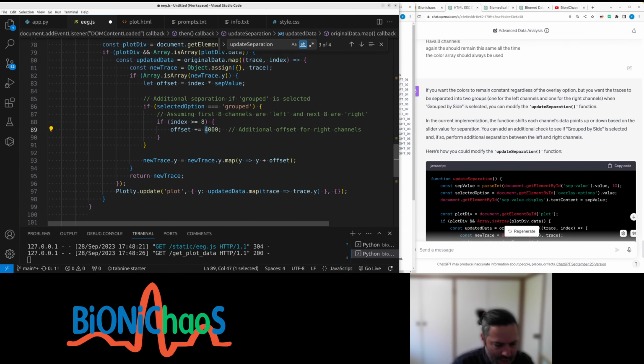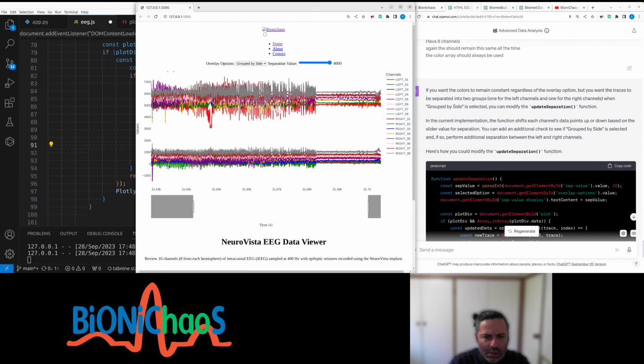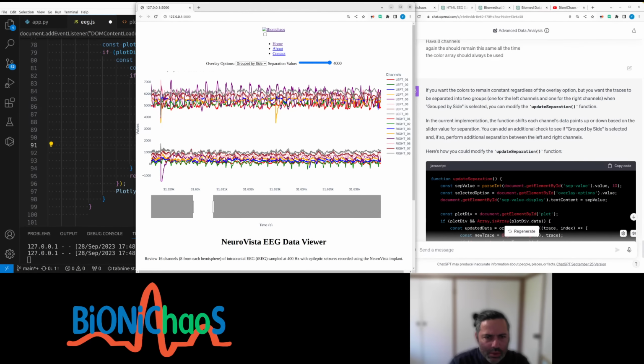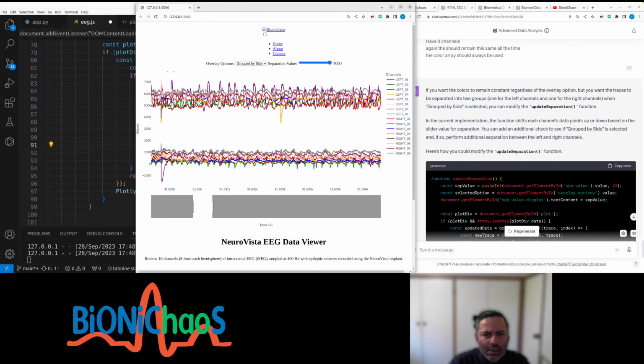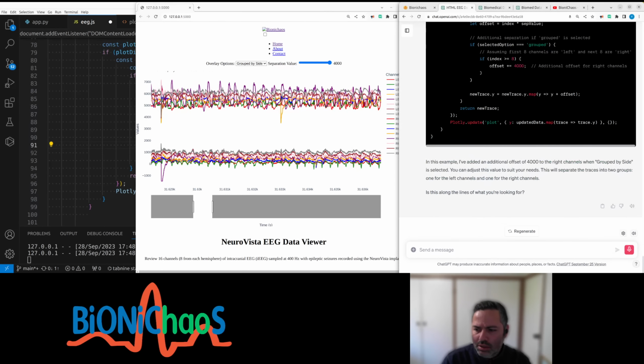Yeah, these numbers should be dynamic. They shouldn't be. That's the outcome I want. So there's a couple of things. Okay, there are a couple of things.